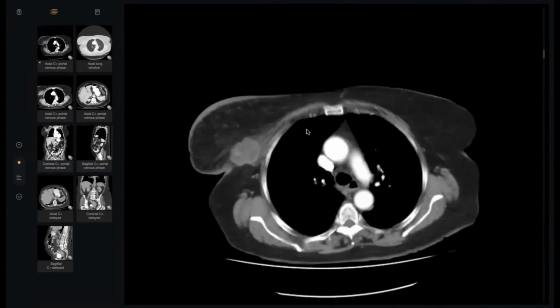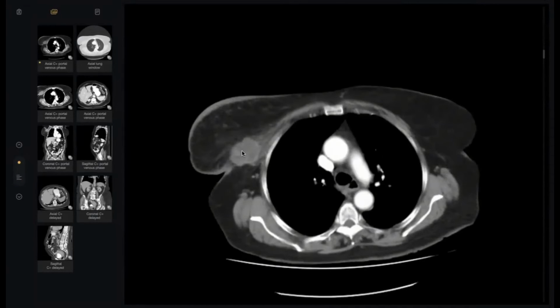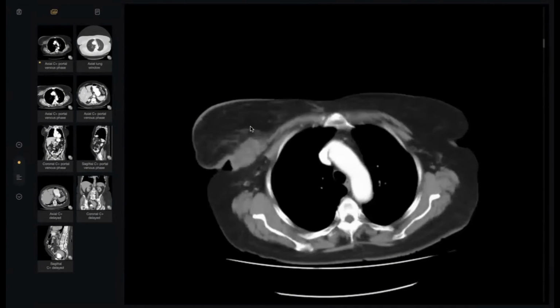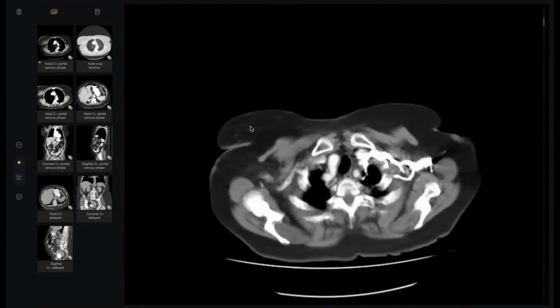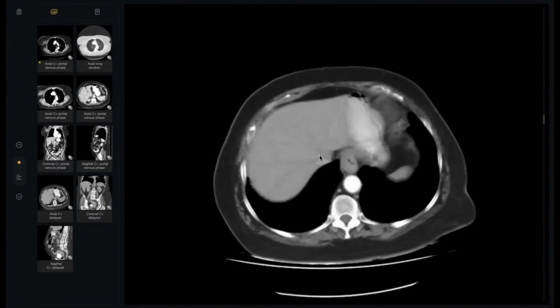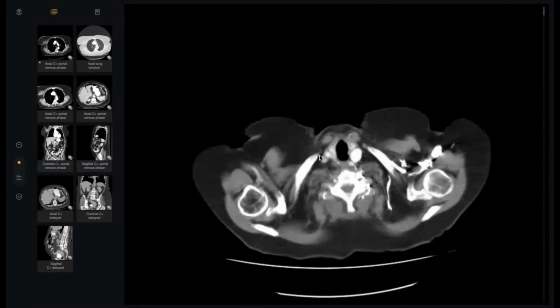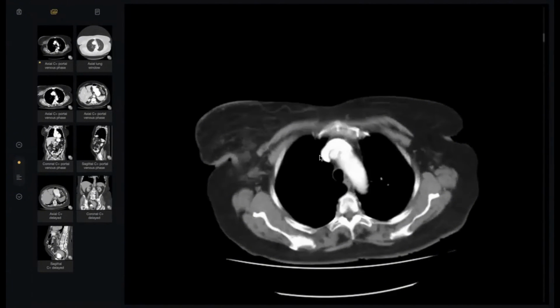It was a case of right breast cancer. I think this is very clear. You can see, doctor, it looks like breast cancer. Why? It is impossible to exclude breast cancer, or to be worried about breast cancer, in this skin edema and malignant lymph nodes. Thank you, doctor. Did very well. Next step after CT staging is bone scan or PET CT. Now, PET CT is very common in breast cancer and I think in lung cancer.